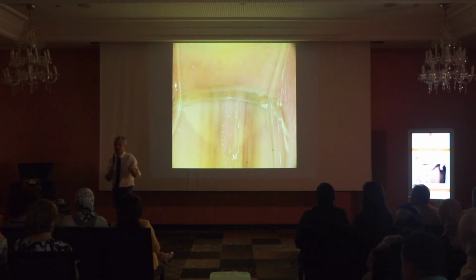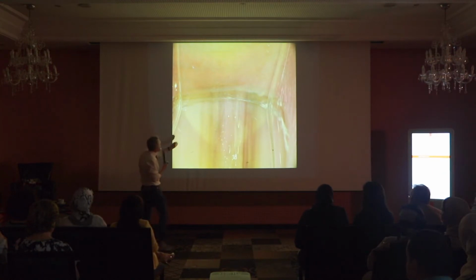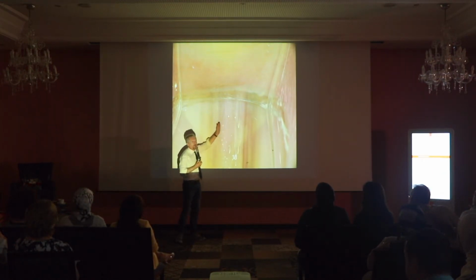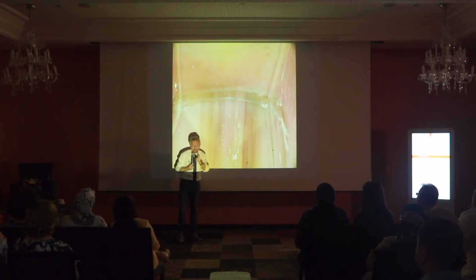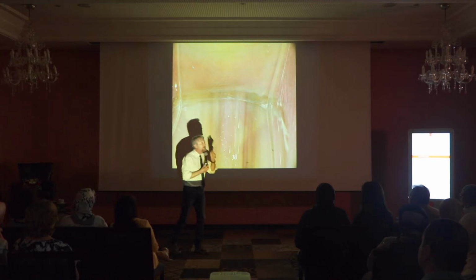So plenty of criteria to say this is a melanoma. Then, in reality, what we did, we basically did a partial biopsy of the nail matrix, no? And on the biopsy of the nail matrix, the diagnosis was nevus.